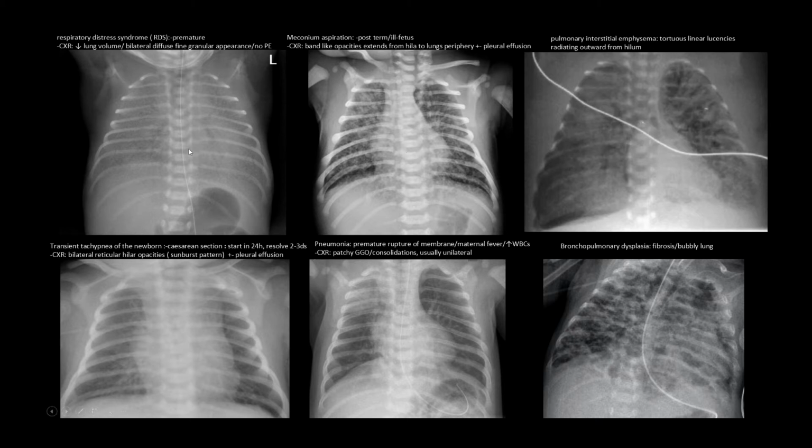First, respiratory distress syndrome usually occurs in a premature baby. And how do we know this is premature? By the absence of humeral heads, and the child will have a small tiny chest, and we can compare it with the ECG leads. Third, the presence of umbilical catheters, which are ideally removed within 10 days to weeks after birth.